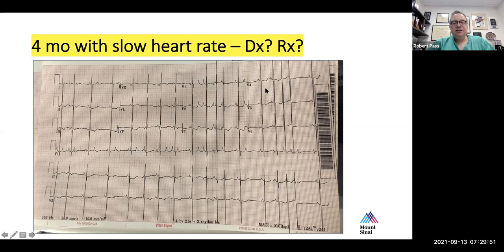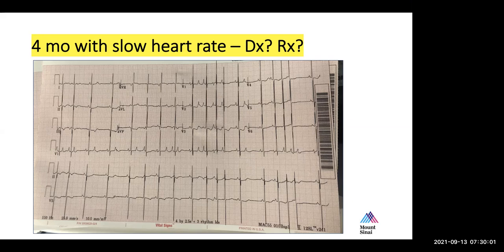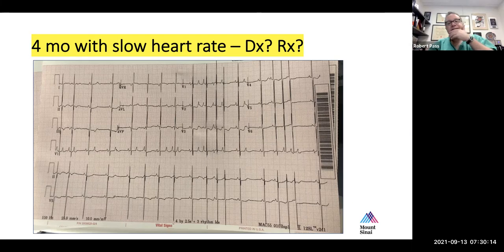So what makes this EAT versus multifocal, or sometimes referred to as chaotic atrial rhythm? What is the difference between those two diagnoses? The shape of the non-sinus P waves seems to be pretty consistent. In multifocal, I think we would expect to see them different. That's exactly right. Excellent, Grace. Really good. So this is an example of EAT.